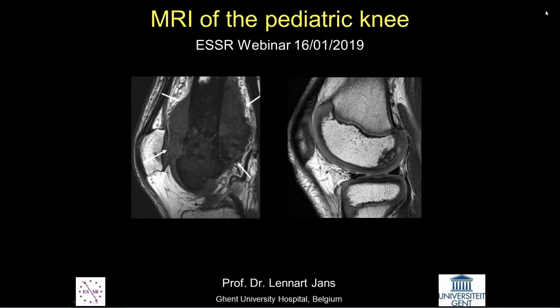So quite often these patients go in for a bone scan first, even though they are children. And there you will see that multiple metaphyses are affected, and they might ask us to do a more specific MRI scan of a certain region in order to rule out for sure that this is CRMO. So it's such a typical entity that I do not really think that confusion is possible with a solitary peripheral bone marrow edema region.